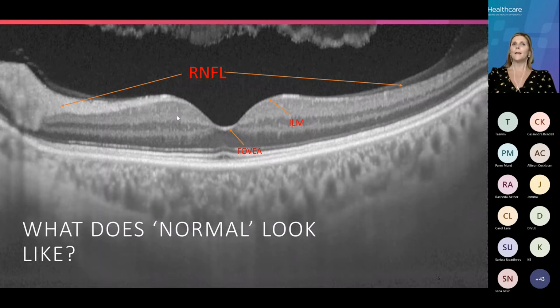It's important to understand there are different types of OCT on the market. With spectral domain OCT, we're looking at a laser wavelength of 840 nanometers. There's swept source OCT, which has a laser wavelength of 1050 nanometers. So with that extra wavelength, we may penetrate that little bit further, that little bit deeper, and therefore you may see some images where you get retina, choroid and vitreous all in one image. In this image, as you can see here, we've got our vitreous, we do have our retinal B scan slice, and we then can see our choroidal structure in quite some depth.